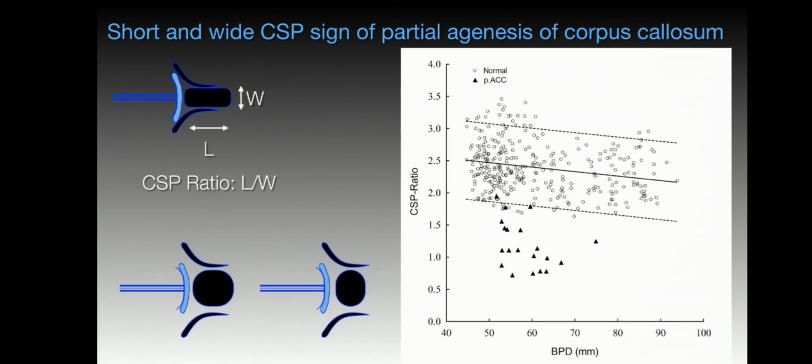You can see it, I think, in the last issue of the White Journal, where you can get this curve, and as you see, the length is three times the width of the cavum septi, and with a ratio less than 1.5, it's very, very suspicious.